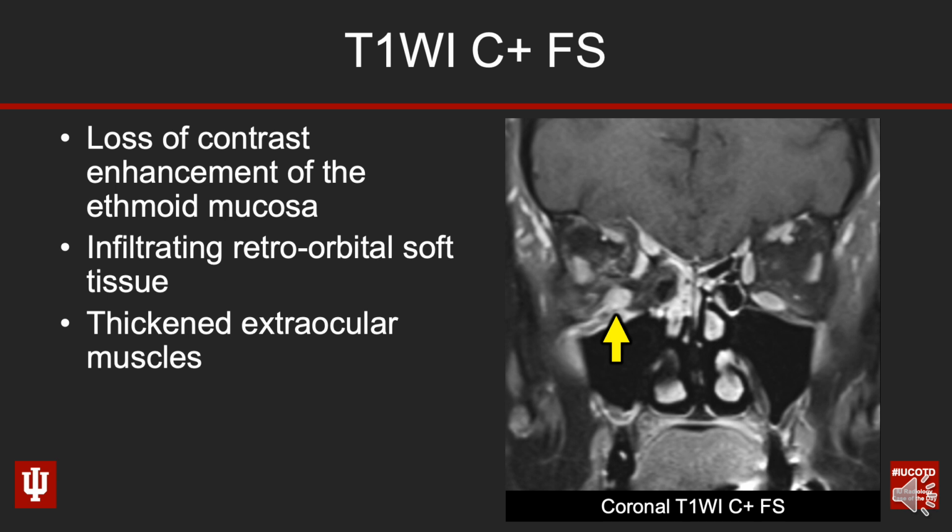It's really critical to use fat saturation on your post-contrast T1 weighted imaging, but not on your pre-contrast T1 weighted imaging. So what's our diagnosis? And what's the next step?